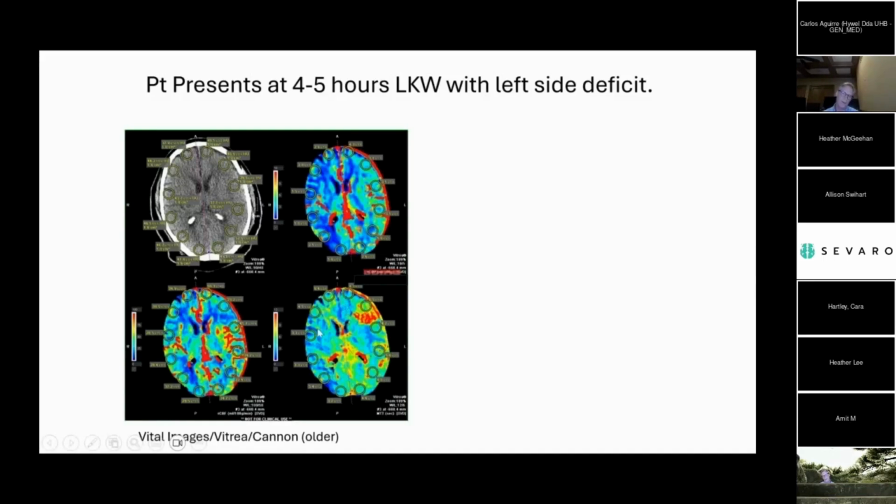So in this case, let's look at the data. This is the normal hemisphere, okay? Everything over here, look at the color scale, is low MTT. So blue and green is lower. The red and the yellow is higher. So we know the stroke is right here at the anterior left frontal lobe. It's also back here at the left posterior frontal lobe, but much smaller.